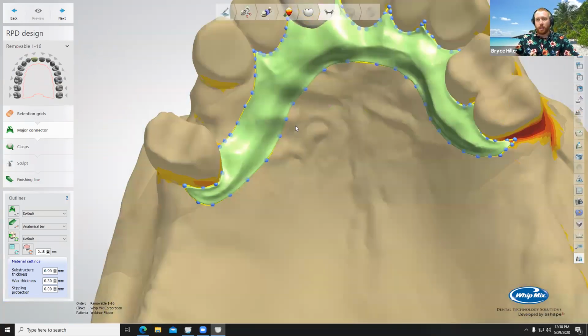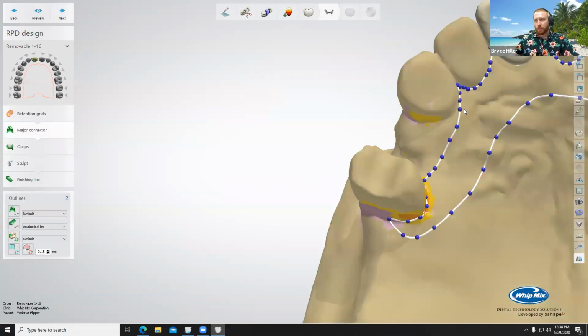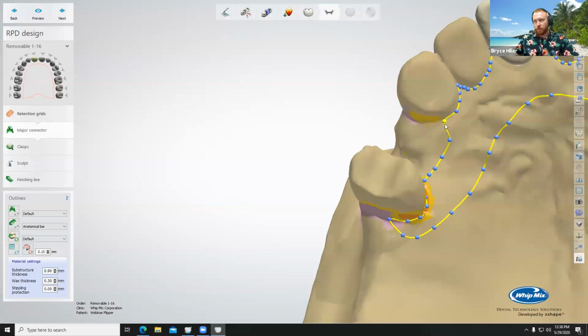Okay, so this looks pretty good. I'm going to go ahead and click next. Actually, I need to fix one thing. It's going to drive me crazy.